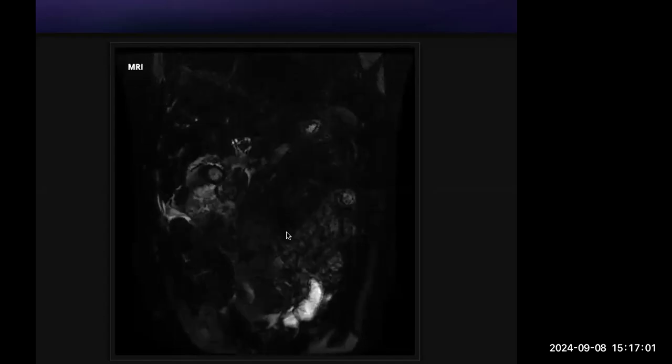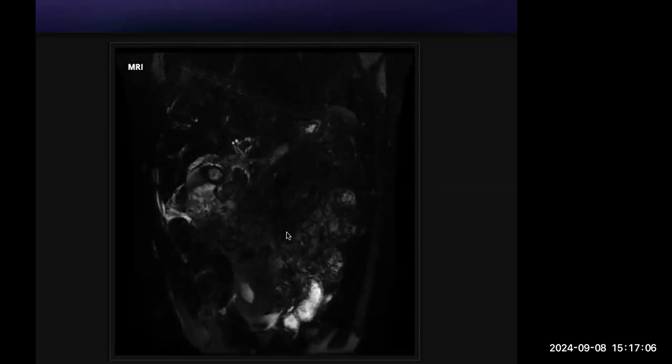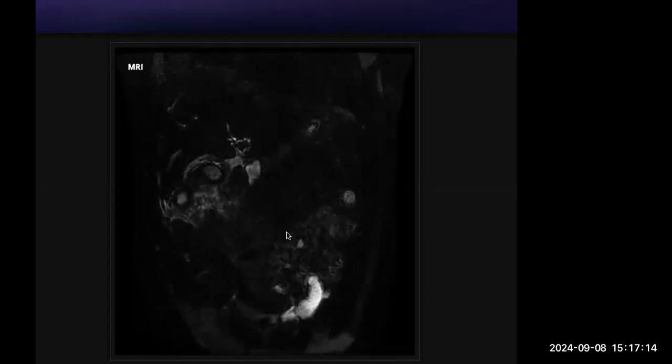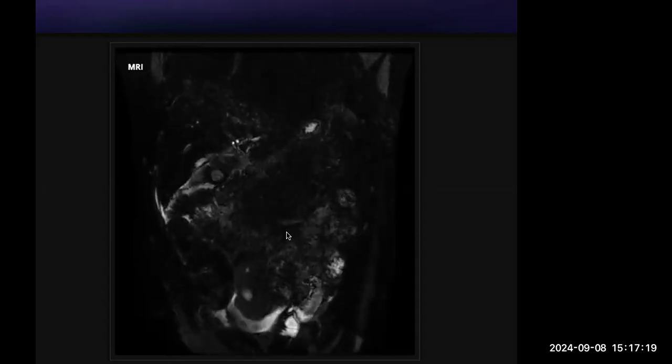So in summary, there is a soft tissue at the porta and the liver hilum, which is involving the gallbladder neck as well as the proximal CBD. It could be neoplastic, or it could be an inflammatory soft tissue, like because of IgG4 associated disease, but they are generally more circumferential and more long. If the patient had any surgery previously, then it could be a post-operative change as well.